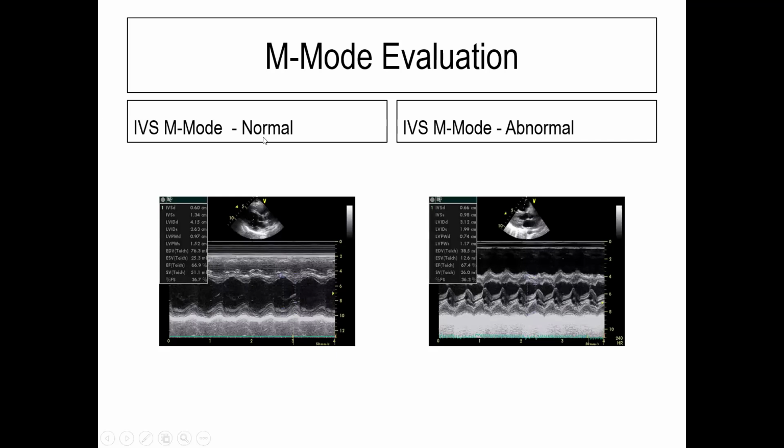This is one patient who has an interventricular septum at the level of the parasternal window, mid-interventricular septum. And this is a cutoff where you see a uniform diastole, systole, uniform diastole, and systole. If you compare this image, you find 2 peaks of systole in the interventricular septum. What exactly happened? This is the diastole. So the septum is already bulging on this side. So it has to go back, come back again, and then contract to do a systolic contraction. And that's how these people present. And I cannot say that you can assess it in one day.